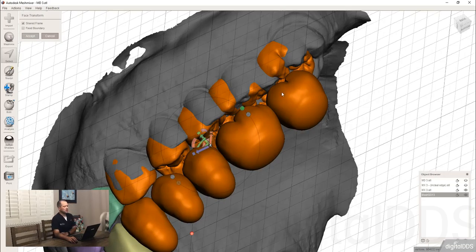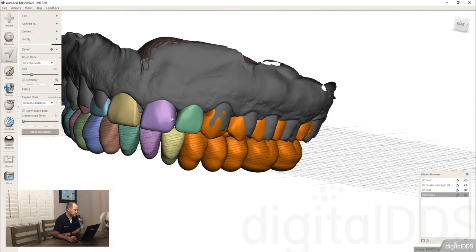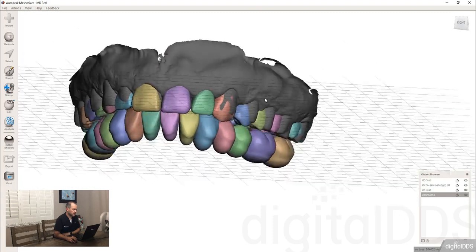especially if you've got a system that, like if your computer's struggling, this will help. And it comes down to one of the very first lectures in this series, and it was about triangles, okay? When there's a lot of triangles on the scene, things get sluggish because every time you move something, it has to move all those triangles.